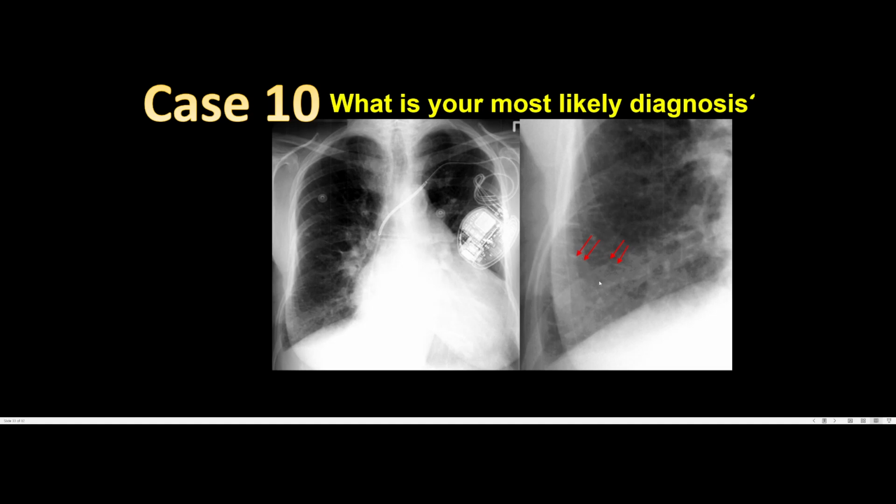There it is. But if we zoom in as a radiologist, we would see that there are very obvious interstitial markings. That means the pulmonary blood vessels are obvious towards the periphery. That means to us that this is a sign of interstitial lung disease in a reticular pattern, a line pattern. And you can look at previous videos on such cases. Now, if we have pulmonary blood vessels being very obvious in a reticular pattern towards the periphery, we always want to assume this is interstitial lung disease in a reticular pattern.